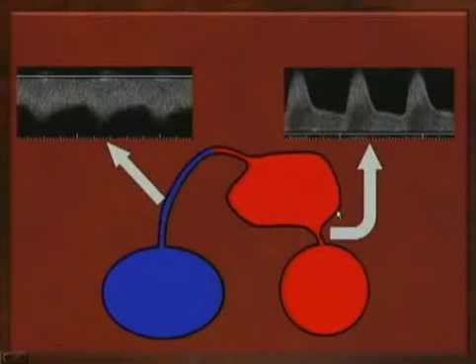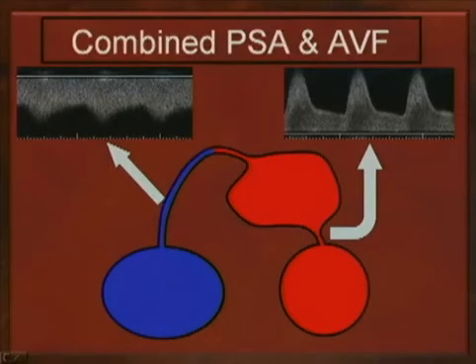So the anatomy here is like this. There's a pseudoaneurysm arising from the femoral artery, but then it connects to a channel that drains into the femoral vein. So injection of this pseudoaneurysm would result in thrombin just spilling directly into the vein, potentially causing DVT or PE. Now, why do you get combined pseudoaneurysm and AV fistulas?